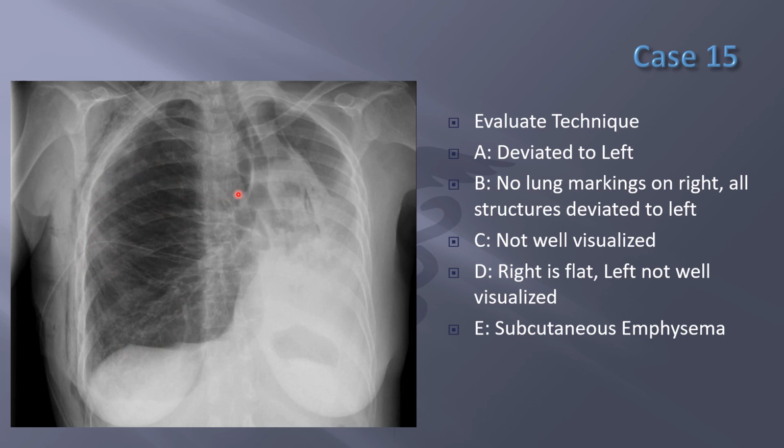So this is a large pneumothorax. It's pushing the lungs over and pushing all the structures over to the left. And air is leaking out here into the soft tissue. And that's why you see it all tracking along here and not here. And the air is actually tracking in the chest wall over the rib cage here. So this is all subcutaneous air in the tissue over the chest. This is not lung markings. Here, you start seeing lung markings, but here is all subcutaneous air in the tissue over the ribs.